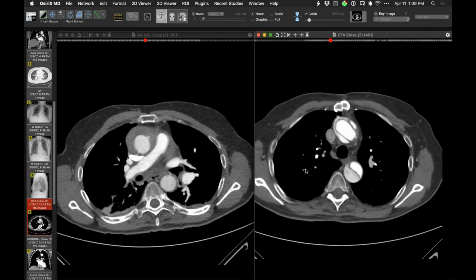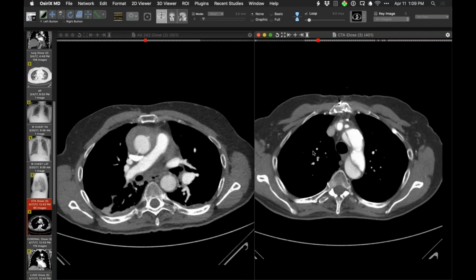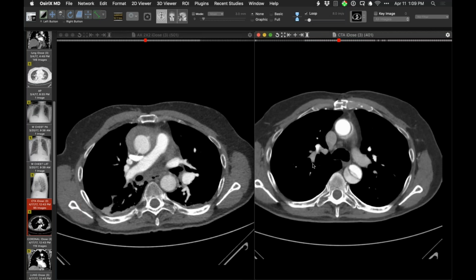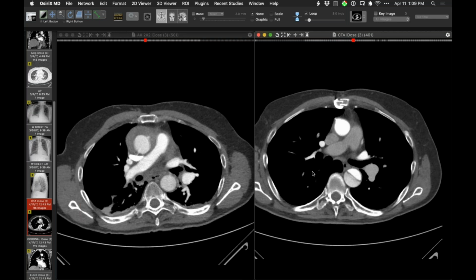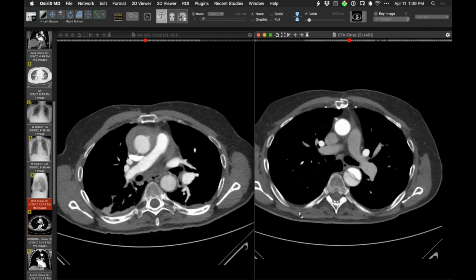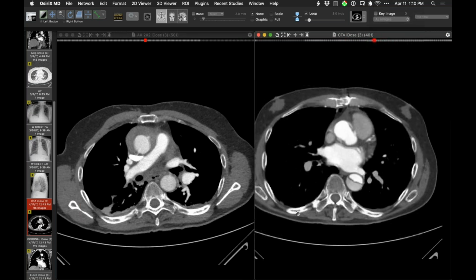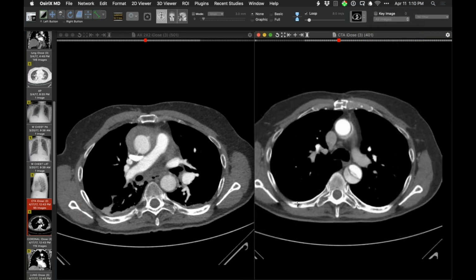Intramural hematoma, ostensibly first, surgery, this is the graft, and then on follow-up imaging, super typical communicating aortic dissection. So one wonders if this was something that then developed to make an acute aortic dissection. But we've all certainly seen that. We've all certainly seen progression of an intramural hematoma to this, or combinations of intramural hematoma and communicating aortic dissection in the same patient at the same time, or the evolution of it, like this patient, after a short period of time.